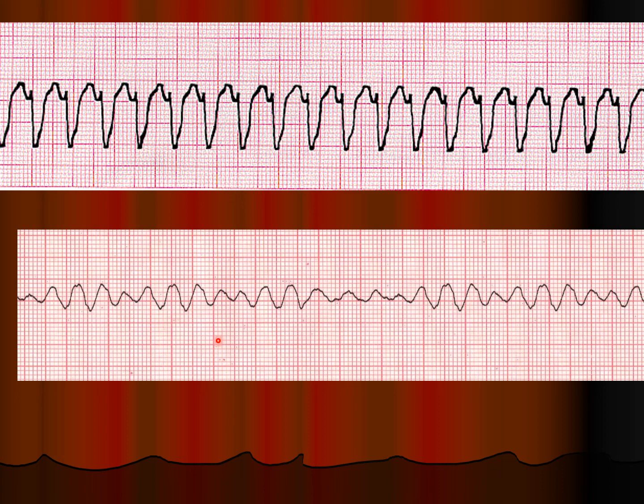Down here, you're like, ugh, it's all schmutzy. See how the amplitude changes? This is not a VTAC. This is a VFib.